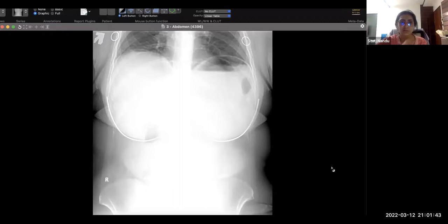I don't know if that's intentional. Don't worry about the spine. Okay. The patient likely has breast implants, and I do not see any obvious signs of rupture. I don't see any obvious fractures or any other obvious abnormality on the scan. I would like to correlate with the history of the patient.